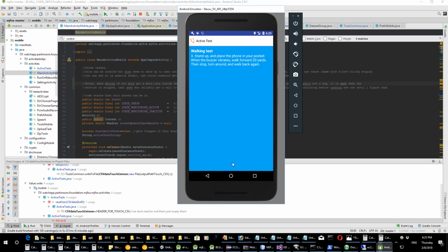And it will reside in a folder that you specify, and I showed earlier. Well, I think I did. And then that will be zipped up. All the files will then be encrypted using AES, and then they will be uploaded to the custom server, which I also developed, which I'm going to show you in a minute.